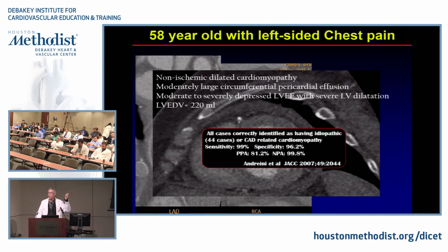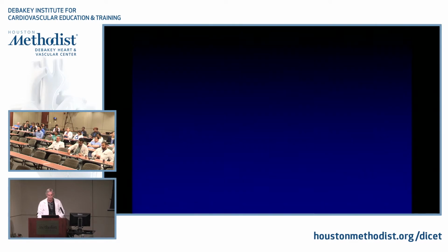It's something we don't often see when we look at the raw data, but again, it's a reason why you should always review raw cine data. Not only does it help you in deciding whether things are real or artifacts, but you can also pick up a lot of other things. Breast tumors, lung masses, liver masses we've picked up before. I picked up an echinococcus cyst one time in the liver, all kinds of crazy things, and of course pericardial effusions. So you should always look at the raw data, always, okay?